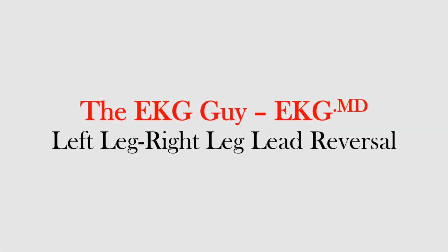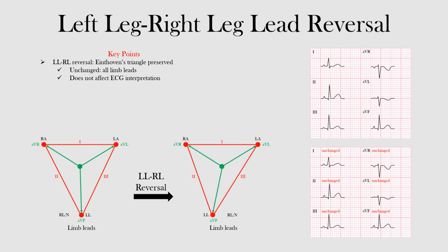In this lecture, we will discuss left leg, right leg lead reversal and how to identify it on the EKG. Making sure that the EKG leads are connected to the correct electrode position is important for getting accurate rhythm strips in 12-lead EKGs. If the leads are reversed, we call this lead reversal. It can often produce EKG abnormalities.